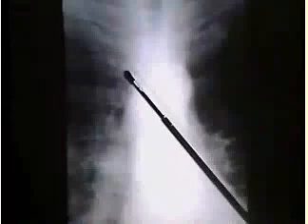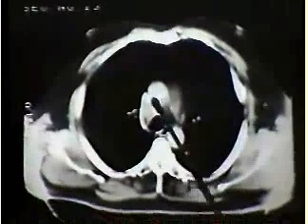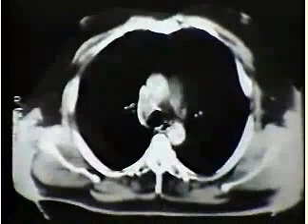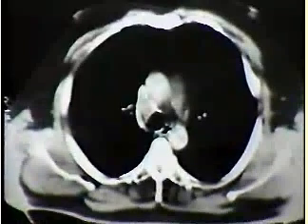They're usually easy to detect when they're significantly enlarged, but here's a patient who has a cancer, which is just off the field here, who has metastases in the upper part of the hilum, who has a normal paratracheal stripe, a pretty normal-looking superior vena cava shadow. This region, I think, would be easily passed as being entirely normal. But in fact, it isn't normal because there is a lymph node mass displacing the azygos vein laterally and filling in the fat pad, a large metastatic lymph node from lung cancer. This is a very common region for these to occur.